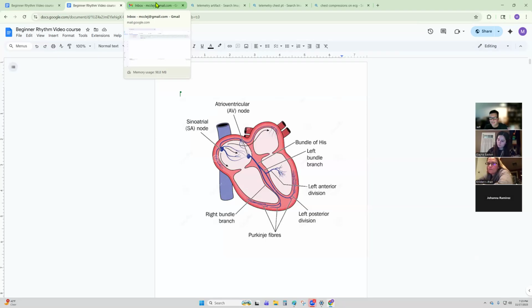What do you think, Kristen? I think it's pretty much asystole. Mm-hmm. With a few attempts to come back, but not. It's just basically muscles not working anymore. Yeah, I mean, at that point, again, we're splitting hairs. We need to be making phone calls instead of talking about the difference between that. We don't have beats that are perfusing blood to the body, and that's bad.